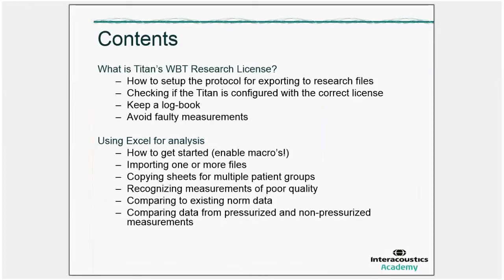Then we will go over to Excel and look at how we can get started with the Excel file that we created for analyzing the research files. I will simply demonstrate most of the things and give some tips, and I hope that at that point there will be more questions about how to use it in the best way.